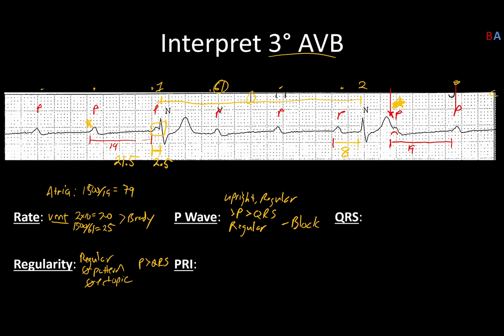They don't create a pattern like we look for. So what I could really just boil this down to is say wildly inconsistent. And because they're wildly inconsistent, there's no pattern, no reset with the dropped beats.